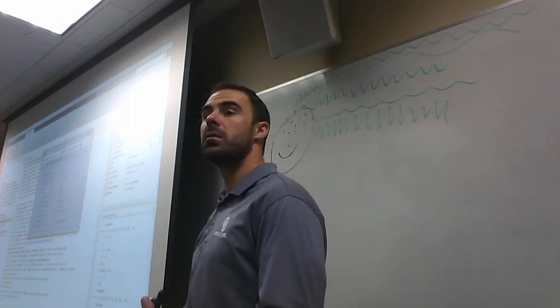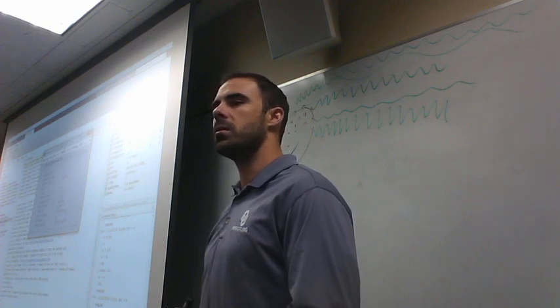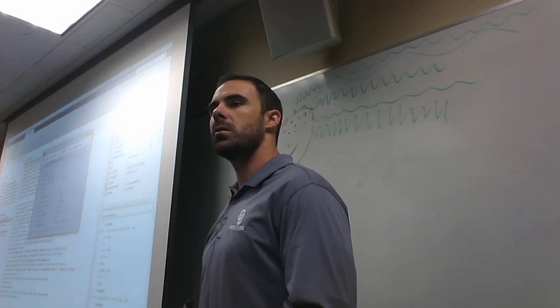Yes, Val? Should we tick the box to save it as a file? On the previous window, we named it. Yeah, and there was a box, save it as file. So you do that. The OK button? No, this one here. No, you don't have... hold on. It shouldn't be, I don't know why you have 2 data sets though. You want to record it using a different function. Where is your first data set?